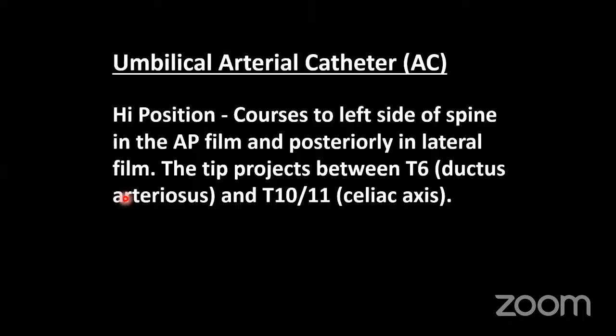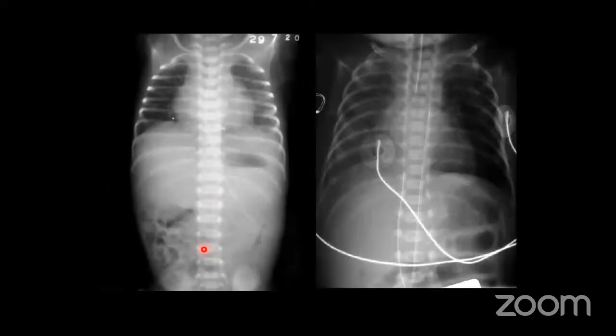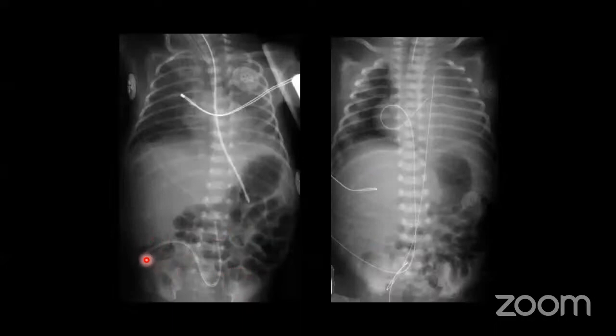Be very careful. You must know the umbilical artery position and the umbilical venous position. Usually the left one is the artery, the right one is the vein, and there is a dip. Usually we see a dip, but here the funny thing is that though it is a left umbilical venous catheter, there was a dip. So sometimes you cannot say it is total copybook teaching. It has gone just like the umbilical artery, but it has gone into the inferior vena cava and then into the hepatic vein.